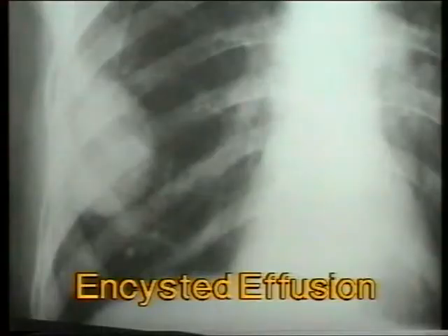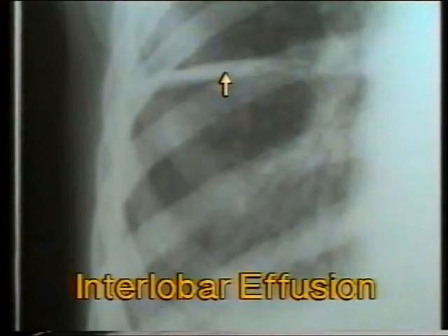An ultrasonography is helpful in confirming the diagnosis and in localization of the point for aspiration of the fluid. Sometimes an encysted effusion lies in the right interlobar fissure and produces a shadow between the 4th and 6th ribs anteriorly. And in a lateral view, a characteristic elliptical shadow of the fluid is seen, extending from the 5th thoracic vertebra behind to meet the diaphragm anteriorly 4 centimeters behind the sternum.